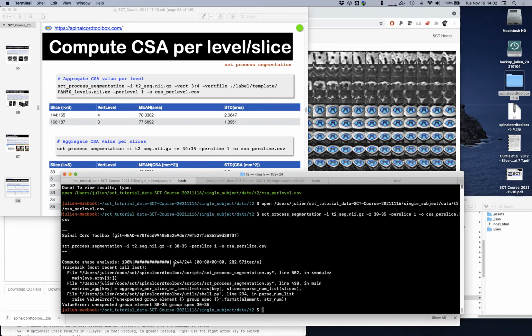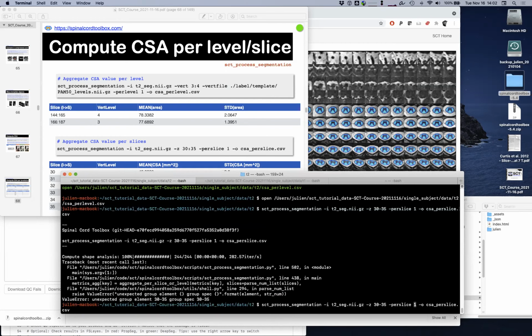Okay, I have a bug because I used the wrong syntax. I should use 2 points like this. It's a good example of when you have a bug, your computer will not explode. Usually it says something that should be interpretable.